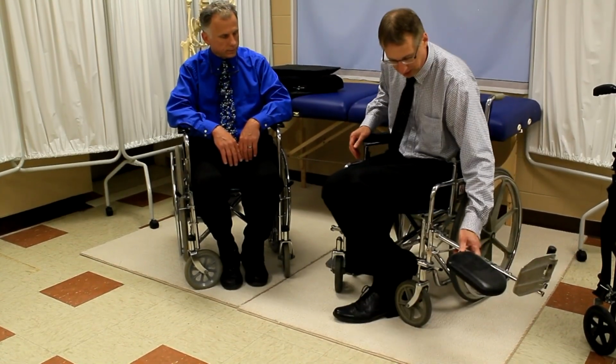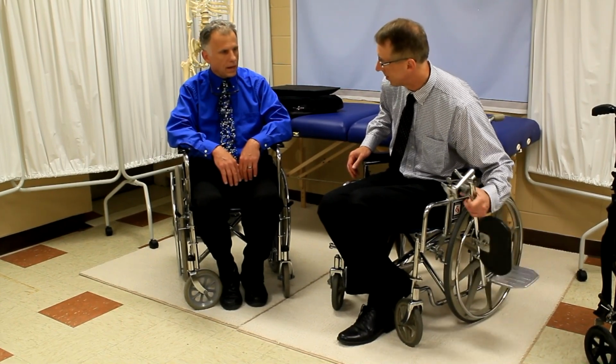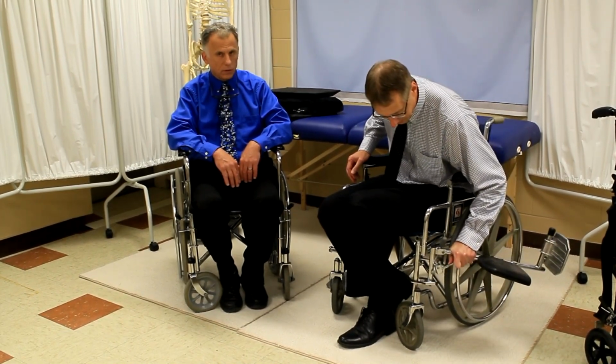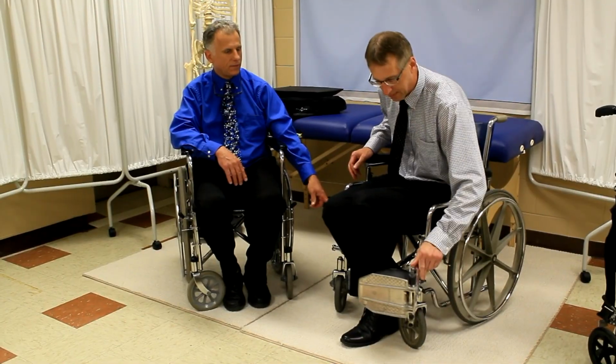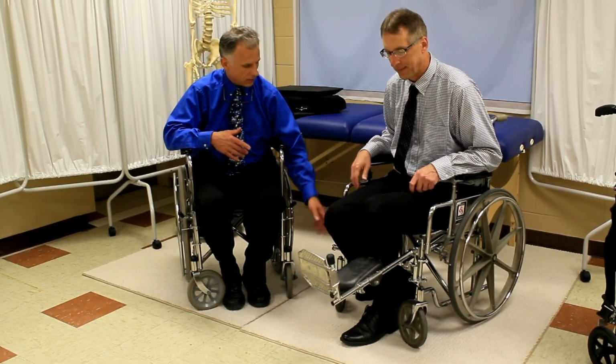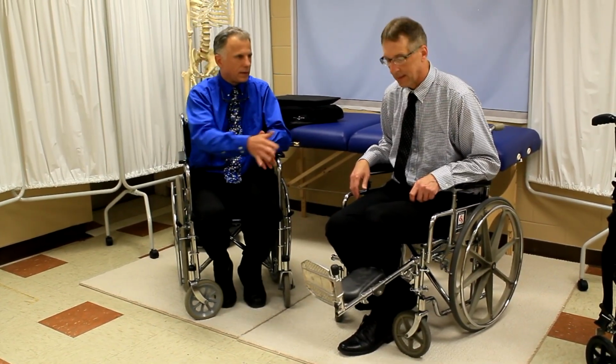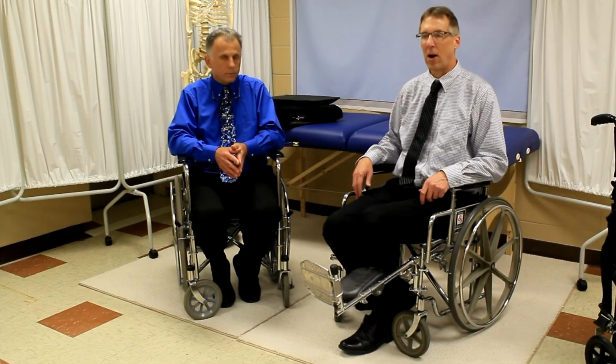And to take it off, you just go ahead and swing it out to the side like this and pop it up like that. These are the types of things, I've been doing this for 20 years and I still have to fight with these sometimes. They're finger pinchers and there's probably 10 different varieties of how they do it. They're a little bit different, but they all work basically the same way. So, all right, thanks.